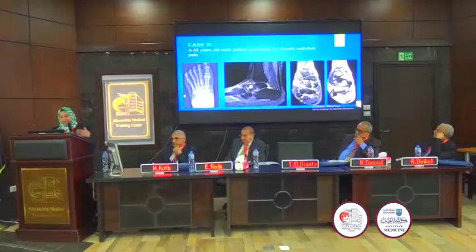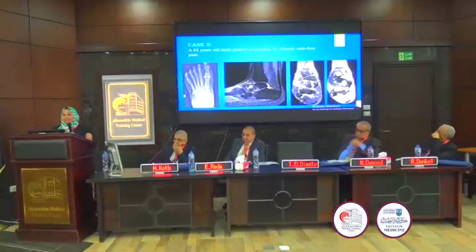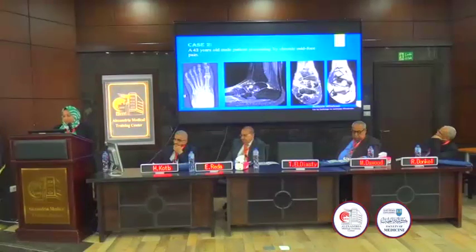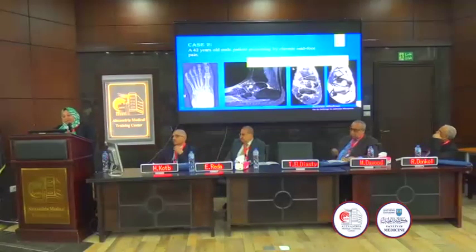I read in the literature that there are theories that this could be because the navicular bone developed from two separate ossification centers which failed to fuse. And Professor Mark Schweitzer in the previous lecture said there is a traumatic theory in early infancy. Now the navicular is bipartite, two fragments instead of one, and the instability between those fragments and continuous friction at the mid-tarsal joints cause mid-tarsal osteoarthrosis. So this is a bipartite navicular bone with secondary mid-tarsal degenerative osteoarthrosis.